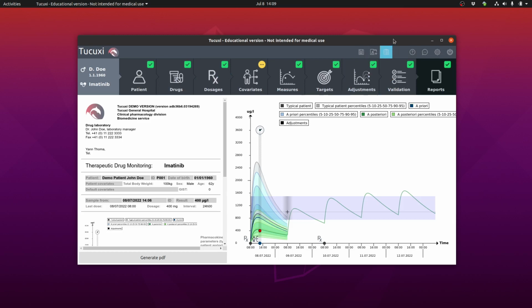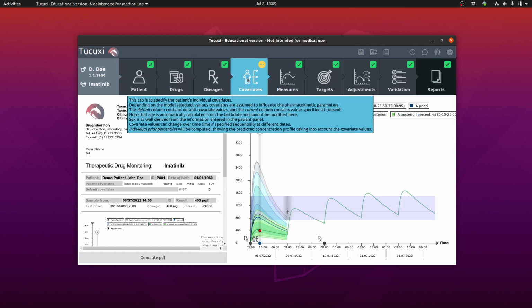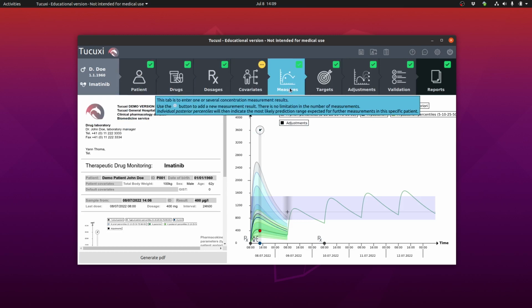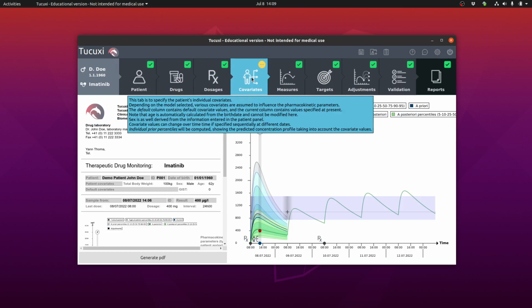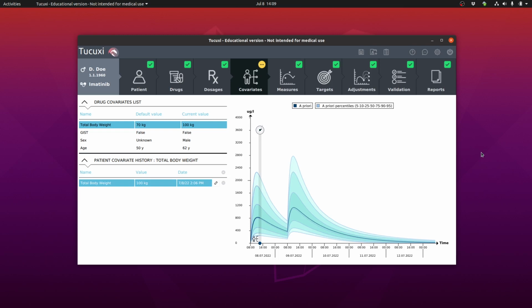And that's it. You have the possibility to save your interpretation. And one thing that could be interesting is that if you press on Control Shift T, then it toggles comments. And so if you go on various parts of the software, you will have some information about what can happen. So that's something that could be useful for you. So that's it for this short demo.